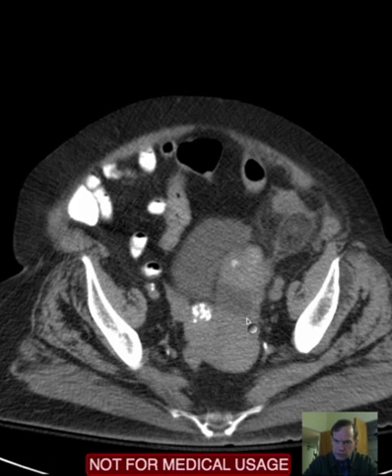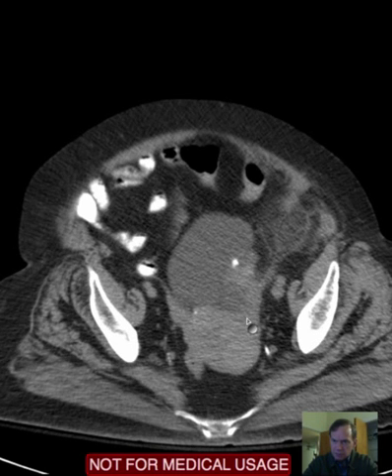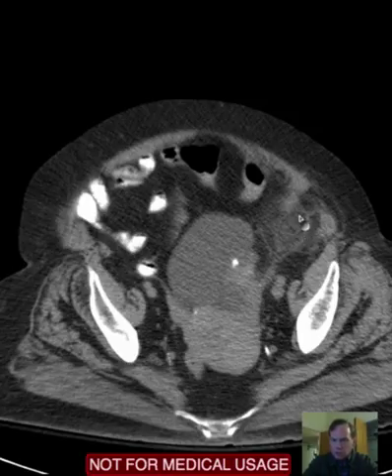But those are not the cause of the patient's pain. What we see in this left lower quadrant is stranding. Stranding means little linear areas of opacity, typically in the fat. So if you look here, you have nice, pretty homogeneous, dark fat.